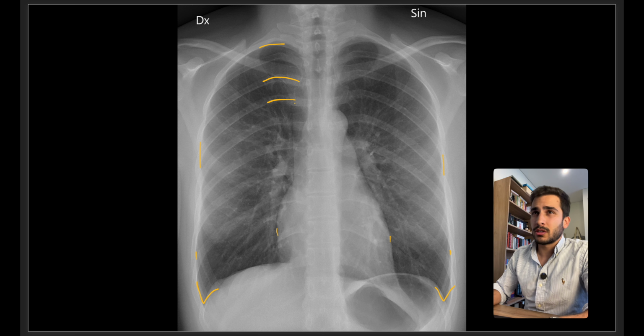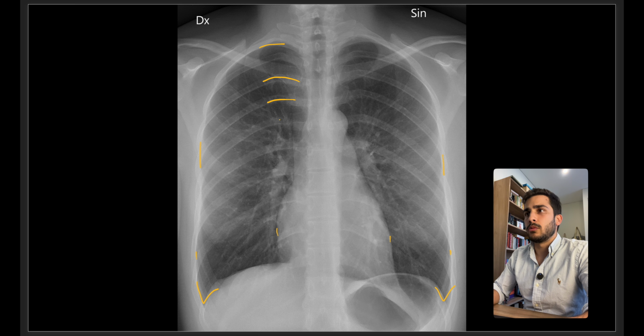We also look at the shape and position of the ribs on each side. Okay, how many ribs you're meant to have is an important indicator of how well the patient has breathed in or not breathed in. The actual shape of the ribs itself, whether it's too flat, whether it's too rainbow-like looking, all of those things. We then have the clavicles on the top over here on both sides. Whether it's angled in a particular manner or if it's too high or too low, that can indicate certain positionings.